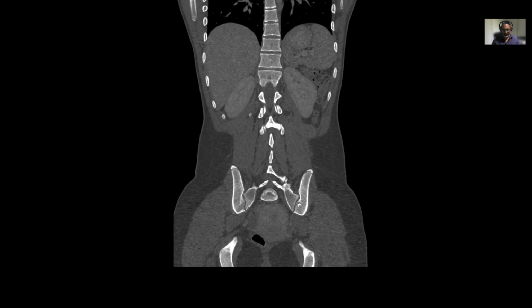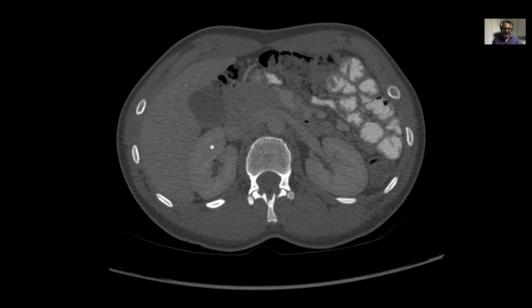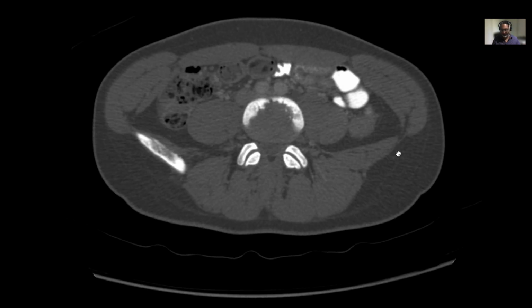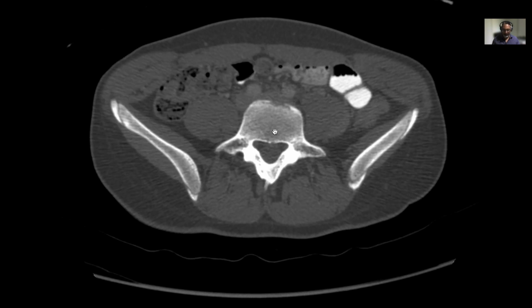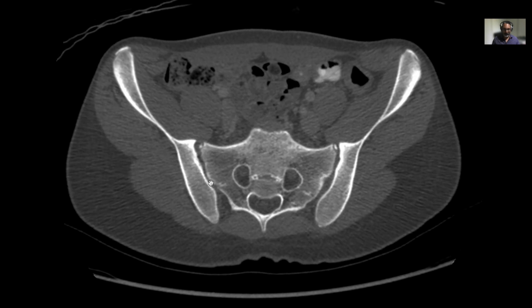The iliac bones are actually better seen in the transverse section because that's how you're going to end up seeing them. Let's go all the way down to see the iliac crests. There you go. The iliac crests pop up right there. So those are your iliac crests. As the iliac crests pop up, the sacrum will also pop up. So that's the L5 vertebra, and then you'll have the first sacral vertebra. And as you see S1, you can see the sacroiliac joints show up, and you can see the first sacral foramen, and that's the sacral canal.